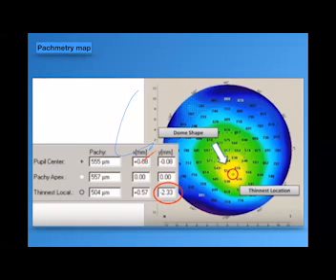You put the patient and the topography and the Pentacam beside each other, and check the same point of abnormality in the Pentacam on the cornea, on the slit lamp.